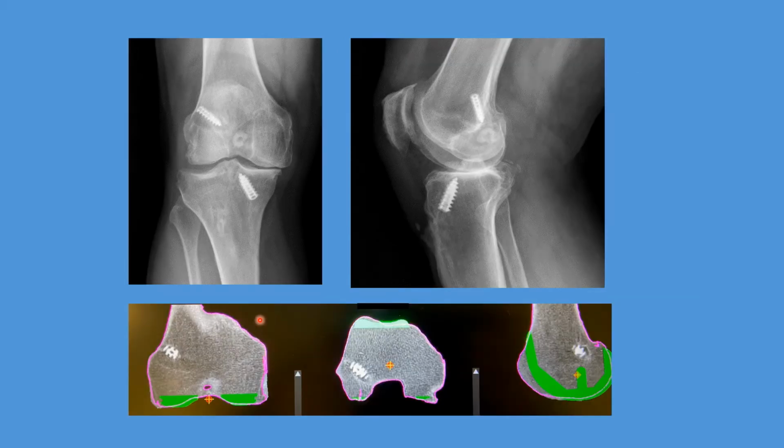So the beauty of the robotic system is that we're able to make a CT model of the knee prior to surgery. So all this planning is done on the front end. In this specific example, we're looking at three different planes or three different views of the femur: from the front, along the length of the bone, or what we call axial, and from the side, or sagittal. And we're going to look at the view in 3 dimensions because, of course, this is in a 3-dimensional position. And we're going to see how our implant, which is green, fits in relation to this screw.